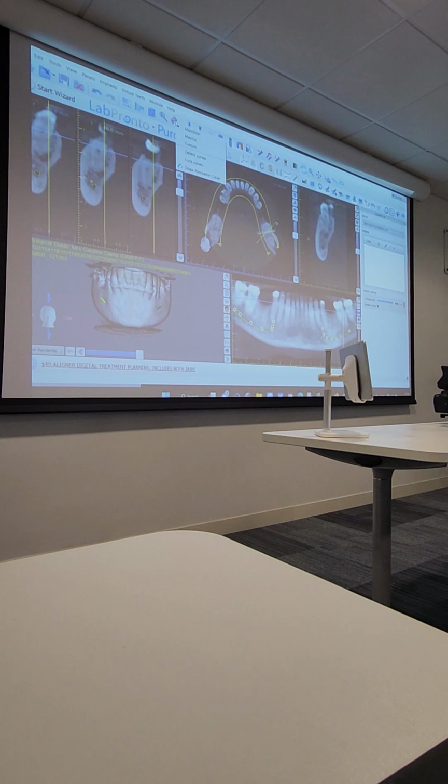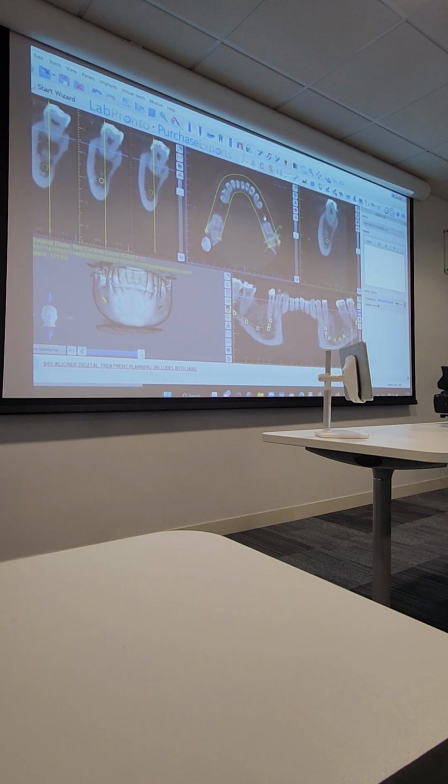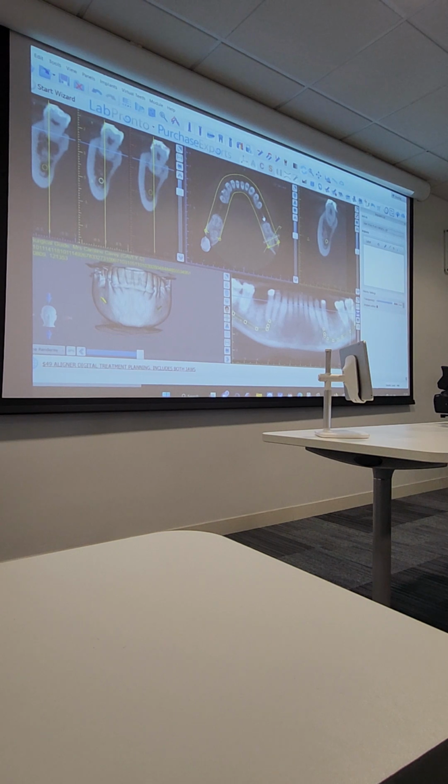Okay? So I'll set my panoramic curve. I just draw a panoramic curve, and now I can go and lay out my own curve on my teeth or my jaw manually. When you get to the last one, you double click and it gives you a new curve. You can use these squares to move things sideways as well. But if you do your panoramic curve properly and in the right position from the beginning, you don't need to worry about it.